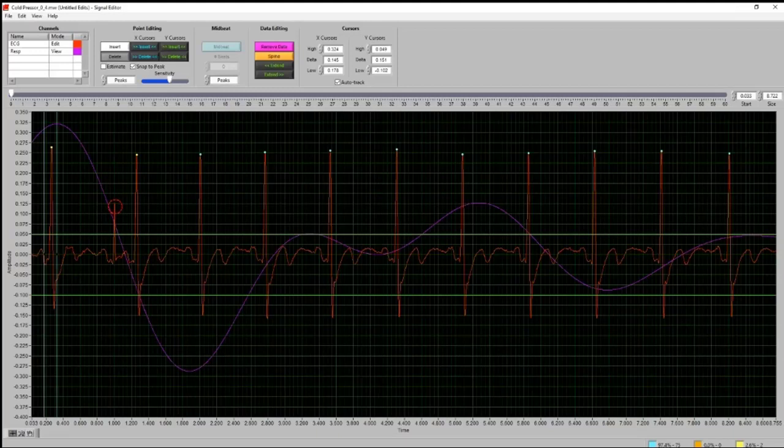And you would be doing something completely different. So in these cases, we really can't confirm what it was that occurred, and it's not our job to do so. But it certainly looks like some sort of ectopic physiology occurred here, or arrhythmia. So what we're going to do in this case is we're going to just stay away from it.